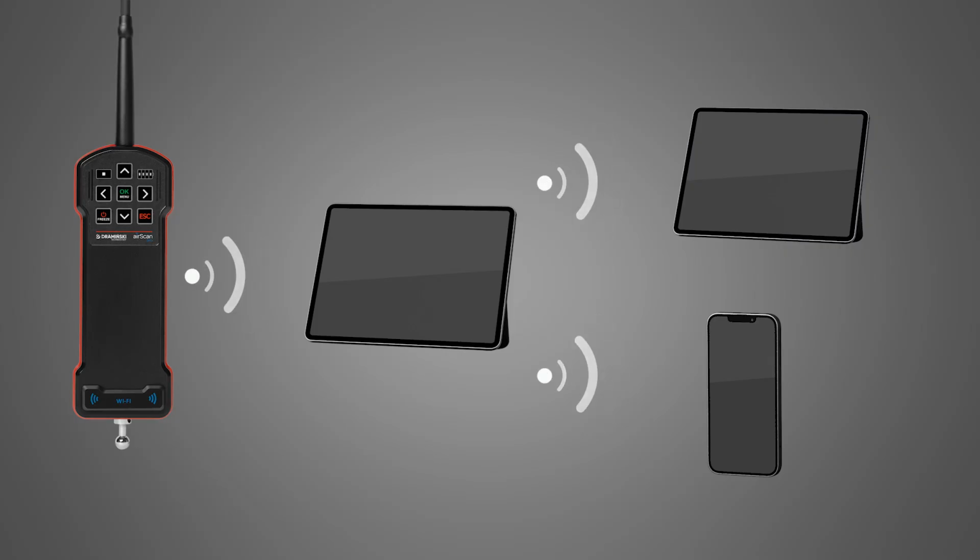If the streamed image stops displaying on your device, make sure you have not lost your Wi-Fi connection to the Draminski network. If this does not help, stop and restart the image transmission in the Draminski screenLink app on the device that is streaming the image.